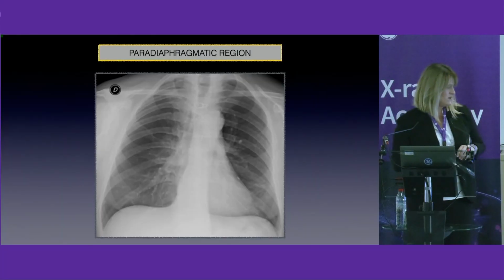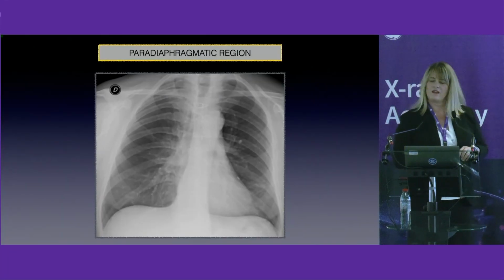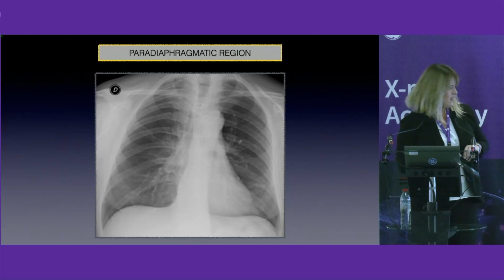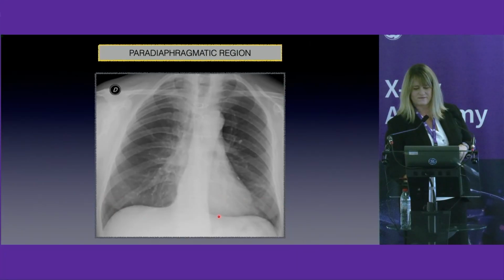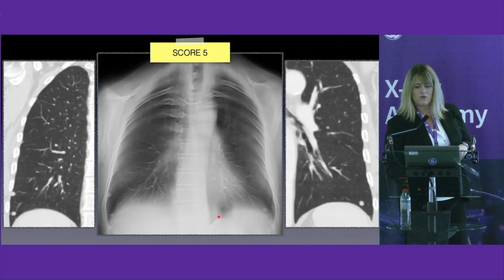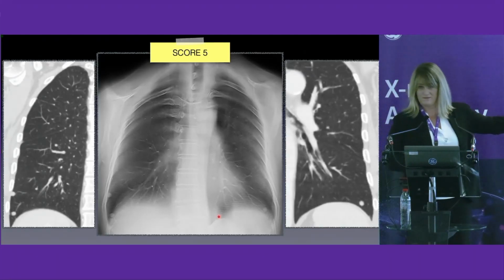What about the cardiophrenic angles? The left one. Take a look at here. And maybe something here. So we perform a DTS. Every nodule was confirmed by CT scan for staging.